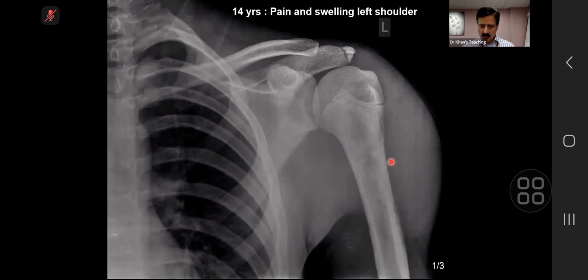Look at this. This is the cortex. This is the cortex. First of all, something is here, right? Then you look at the medullary cavity. Look at this medullary cavity. As we go in, look at this medullary cavity. There is something wrong. Even if you pick up that I am a bit worried and something is wrong, actually there is a bit of permeation. Look at this pattern. It doesn't make sense. And with that, the soft tissue.